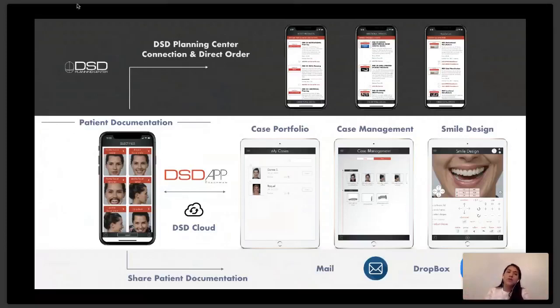Afterwards, you can also connect to the DSD Planning Center to order their products, and we can get more in depth into the Planning Center products with the implementation course. So I invite you to join my implementation course. I'm going to tell you later how to do that.